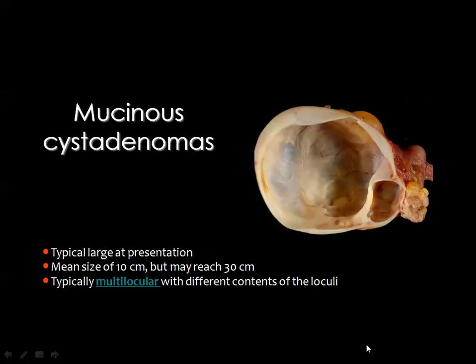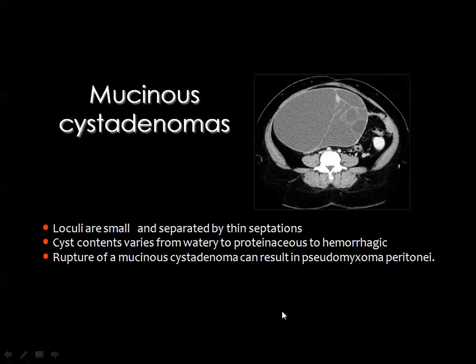The mucinous cystadenoma is characteristically multilocular, and this cyst is also of large size. It can be small or can be large, but to be differentiated from serous cystadenoma, this cyst contains internal septations and may sometimes contain calcific foci, but if you see mural nodules or masses, this will turn this cystadenoma into the malignant component, which is a mucinous cystadenocarcinoma.